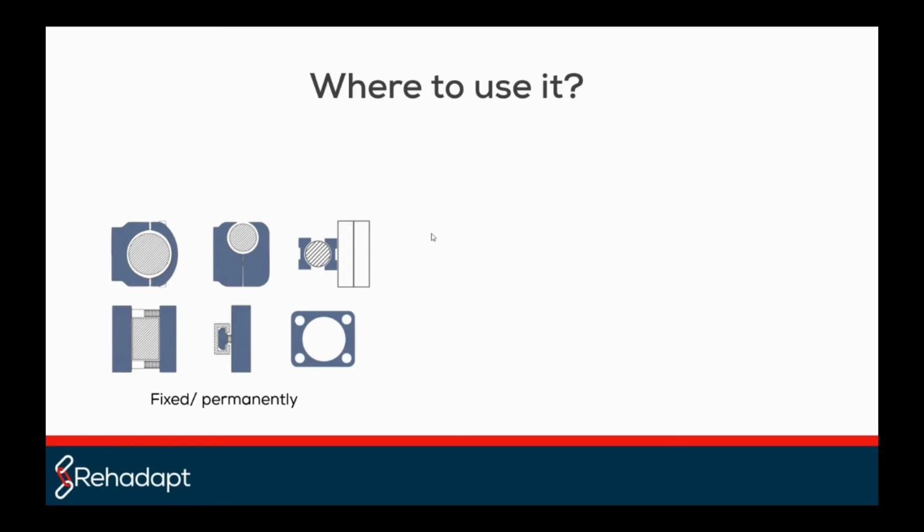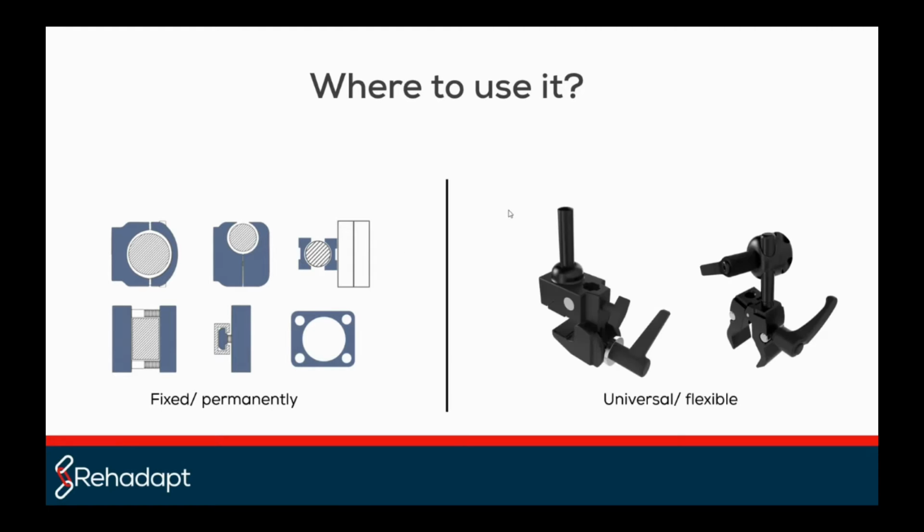But also, often people are looking for a little bit of a more flexible, variable kind of tablet adaptation solution, thinking about clamping something on a table. So also there, we have different kinds of options with some variable solutions like these table clamps that we can simply attach to a table, clamp it there, and attach it in combination with stuff like rigid tubes or a gooseneck, depending on the individual customer demands. So everything from this end is often possible. But also here, you need to see the difference.